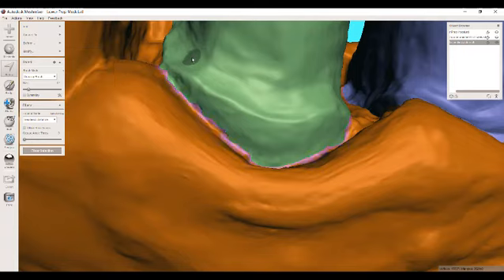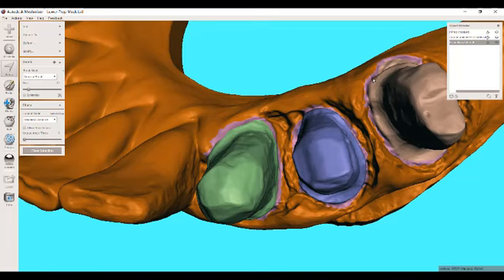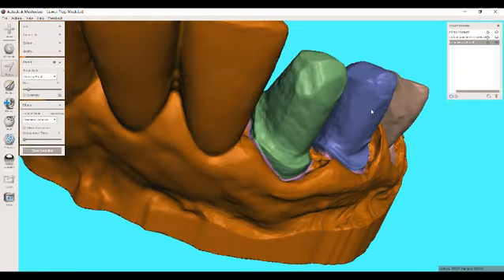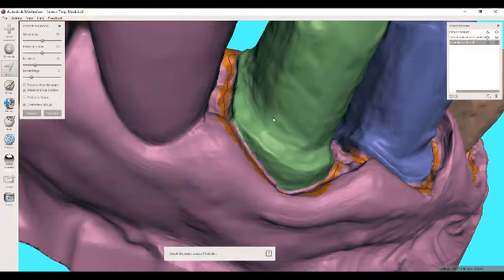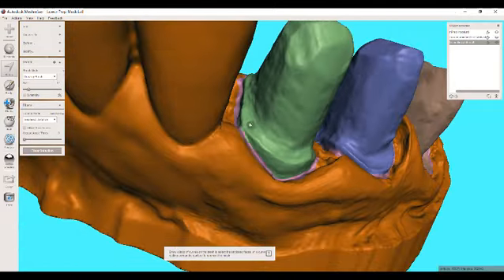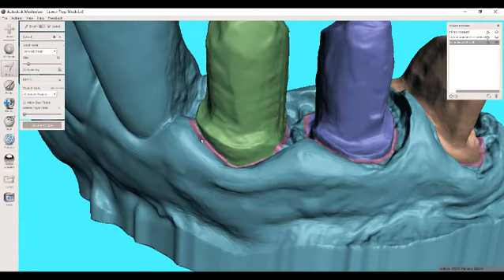And you see what happens when I do that is that my ring is contracting by one triangle in all directions each time that I do that. Okay, so I did it 5 times, and you see that has created a new boundary here. And with that done, I'm going to once again hit B for smooth boundary. And now look what we have. We have these 3 pink face groups.